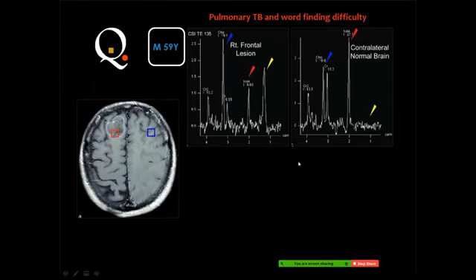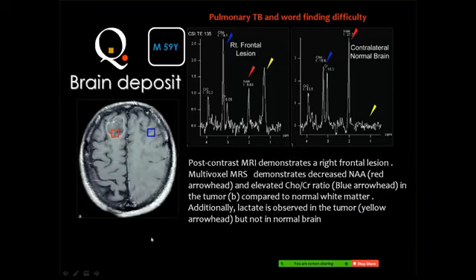Yes, and this is very important. Whenever you are asked about spectroscopy, you look first for the choline. If the choline is high, then you consider a neoplastic pathology. Then forget about the spectroscopy, then go to the MR appearance. If you see enhancement and this is a tumor, what do you think? Metastatic. Yes, metastatic or glioblastoma multiforme. They both can present by the same appearance.